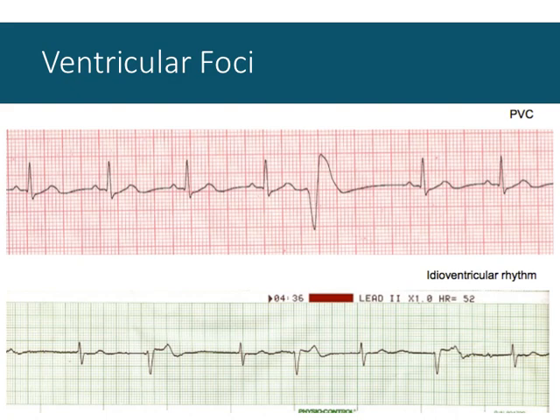If it's not momentary, the subject exhibits what we call an idioventricular rhythm, which you can think of as regular premature ventricular contractions, regular PVCs. You can see, I'll try to highlight them here, regular premature ventricular contractions, highlighted in the green boxes, where we have otherwise normal sinus rhythm that is interrupted at regular intervals by the ventricles firing.